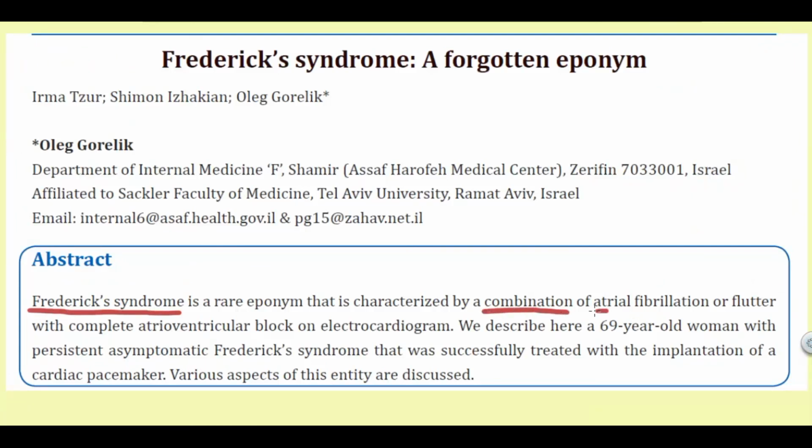Frederick syndrome is a combination of atrial fibrillation or flutter with complete atrioventricular block on ECG.